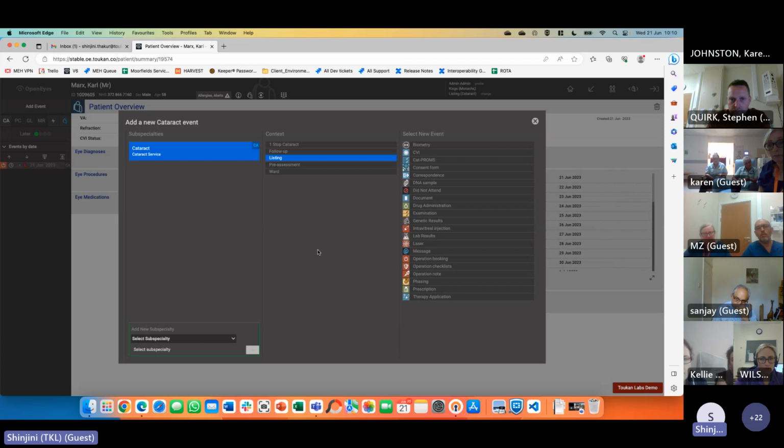I will show you what I'm talking about in a minute. So let's say this patient is coming for a clinic today and I want to record an examination. Examination is where most of the clinical data goes.